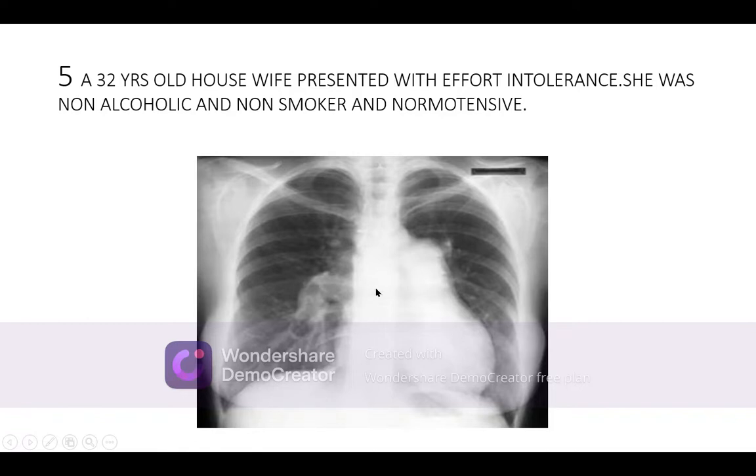So for primary pulmonary hypertension, confirm it by echocardiography, HRCT should be done, and you will see the pressure inside the pulmonary artery. Catheterization studies can be done to confirm it is primary pulmonary hypertension, because there is no secondary cause for the pulmonary hypertension here.